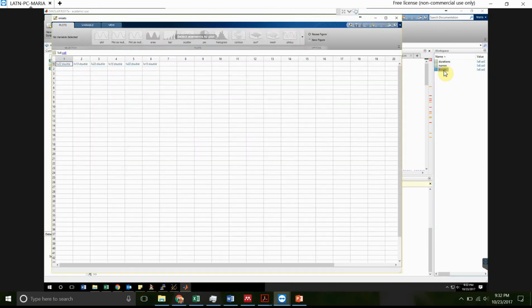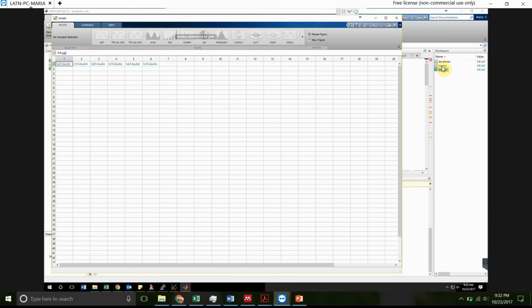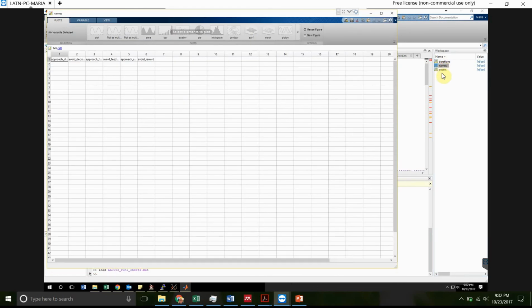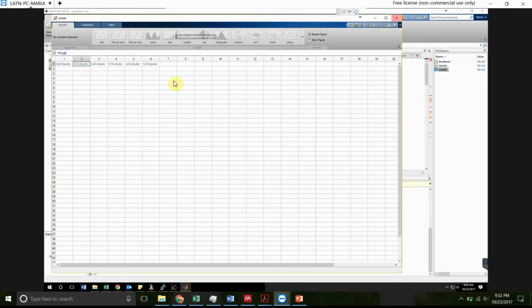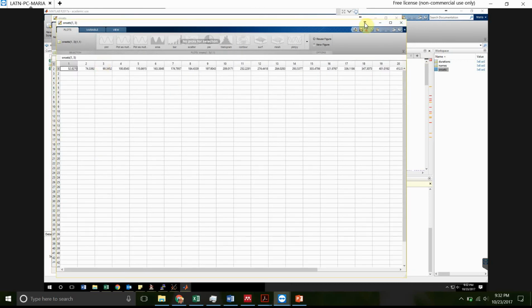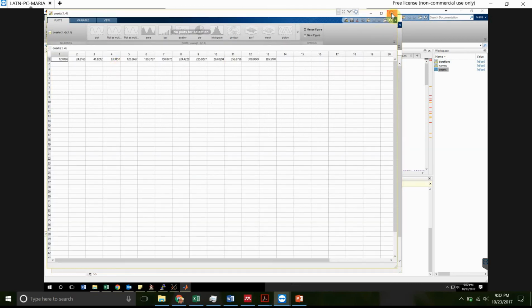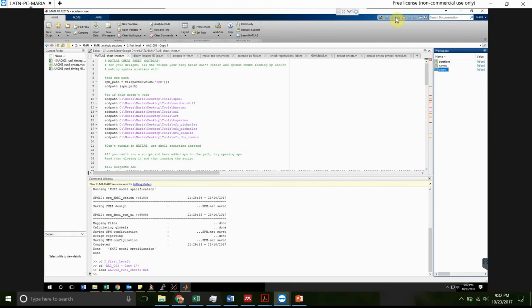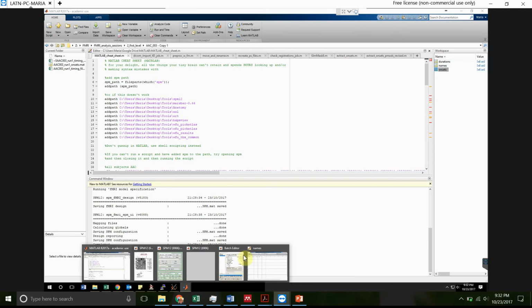And then onsets. So it's nested underneath the onsets of each of these conditions. So onsets for 1, which is the first, those are the onsets for the approach decisions, and the onsets for the avoid decisions are in here, and then the onsets for the approach feedback, avoid feedback. So you can see how copying and pasting these might have led to a lot of human error. So that's the format of your multiple conditions file, and I'll show you how you enter it into your first level analysis now.